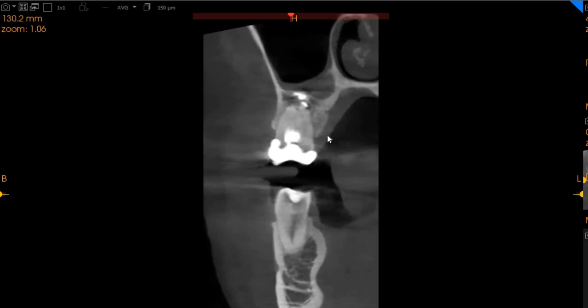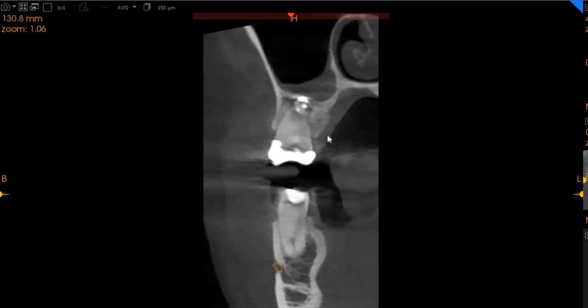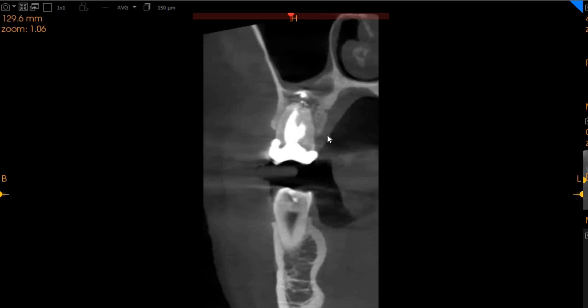And we've got a lot of radio-opaque dental material present in the periradicular tissues, which can be contributing to the infection, periapical radiolucencies, pain on biting, and overall pain to the patient on the upper left segment. So this is what we see.